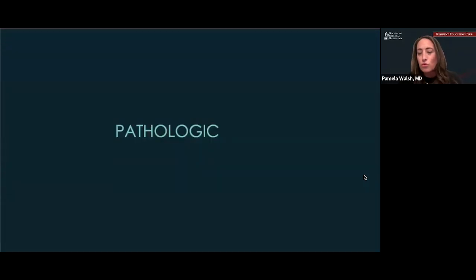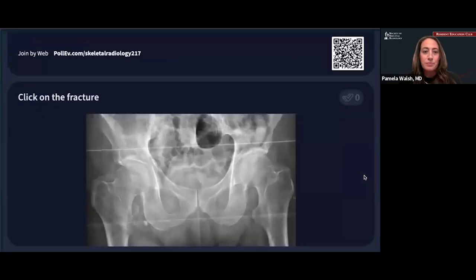Okay, so let's move on to some pathologic cases. So let's see if there's a fracture here.